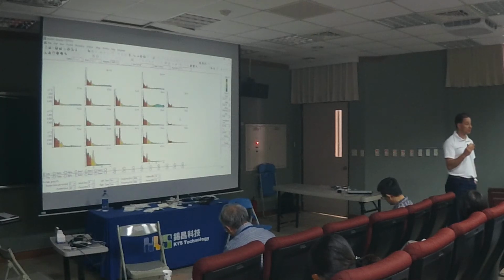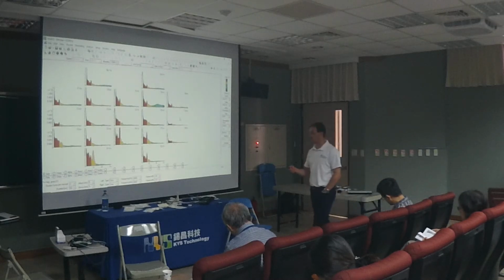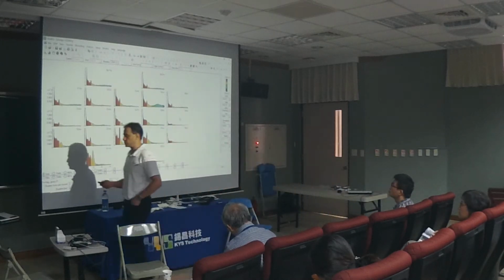Peak alpha frequency above 10. The higher, the smarter the person is, right? So let's look at this guy's peak alpha frequency because he's 11 years old.